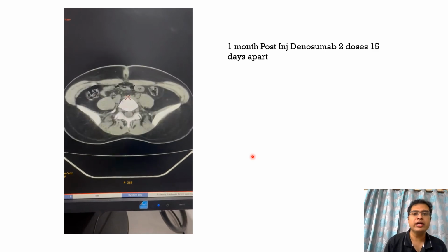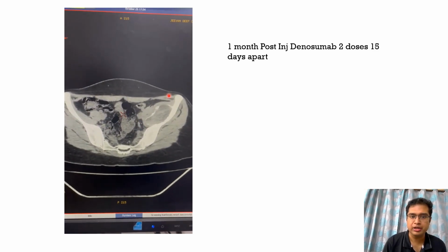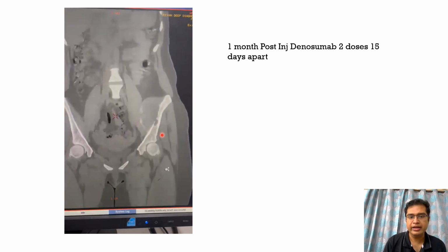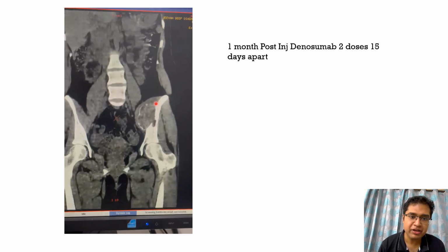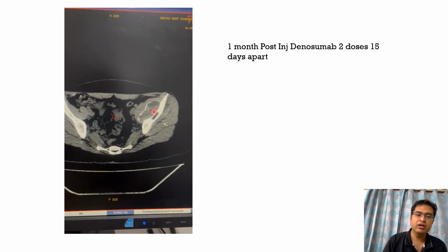So this was post denosumab injection, 2 doses, where we can see that there is a decrease in the fluid levels and a layer of calcification around the lesion. There is of course a lytic lesion, the lysis of the iliac bone, indicating its origin from the left iliac bone. But definitely post denosumab there was a decrease in the fluid levels and a thick calcific rim around the lesion. This was advised by the surgeon before the surgery so that the lesion could be well delineated and easily resected.